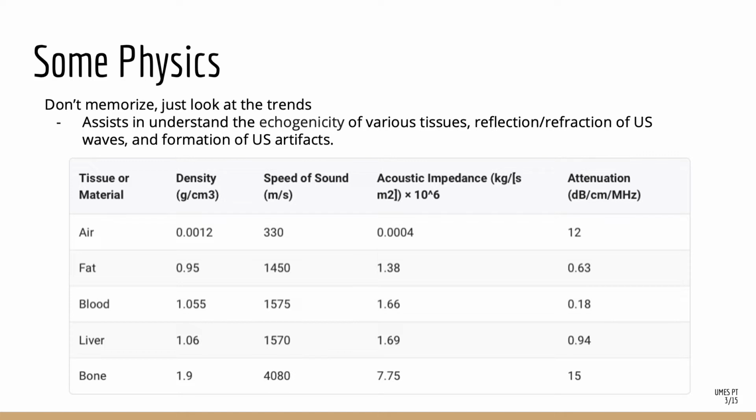Reflection, this is why bone and air appear as bright lines on ultrasound, and also why you get the reverberation or reflection A lines that we talked about with the pulmonary ultrasound. There is such a large difference between the impedance of tissue and bone or air that they will cause almost all of the ultrasound waves to reflect back instead of penetrating through. What is interesting is these values both cause reflection because of the drastic differences in the impedance of soft tissue.